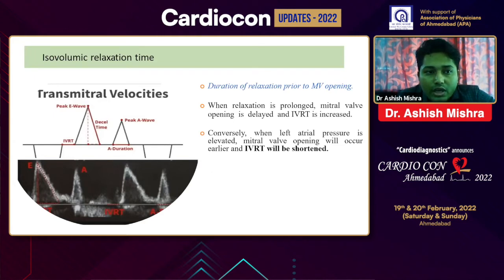Now the assessment of IVRT, which is the isovolumetric relaxation time. The duration of relaxation prior to mitral valve opening is important. When relaxation is prolonged, mitral valve opening is delayed and IVRT is increased. Conversely, when left atrial pressure is elevated, mitral valve opening occurs earlier and IVRT is shortened. Typically, this is the time frame between the ejection phase and the initiation of the E wave. So the time interval between the end of ejection and the initiation of the E-wave velocity at mitral inflow is the IVRT.